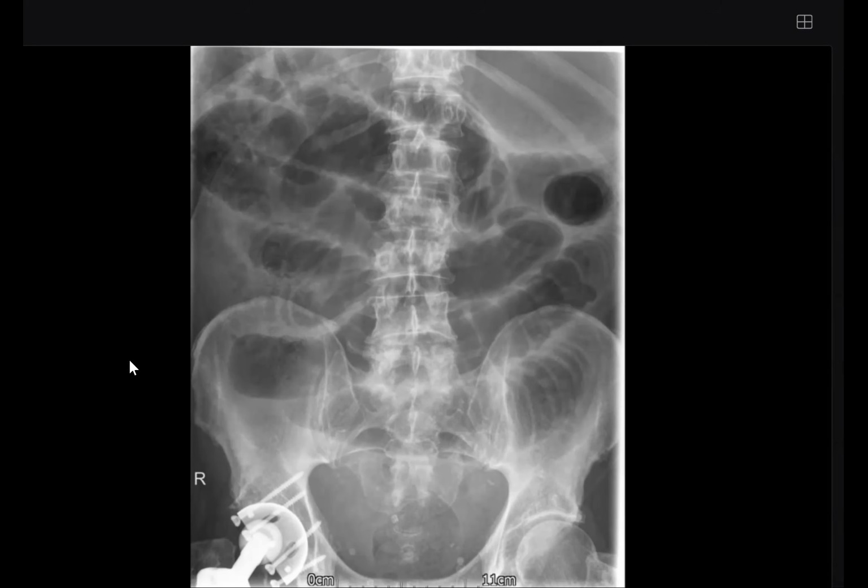Do you need any other radiograph? You said upper abdomen radiograph. Do you cover the lower abdomen to rule out hernia? Hernial orifices covered or no? I would also request an extended radiograph of the lower abdomen to include hernial orifices. Good. Then finalize small bowel obstruction, possible cause one to three, and I need a CT scan. Don't forget, please, hernial orifices. It's very important in the exam.